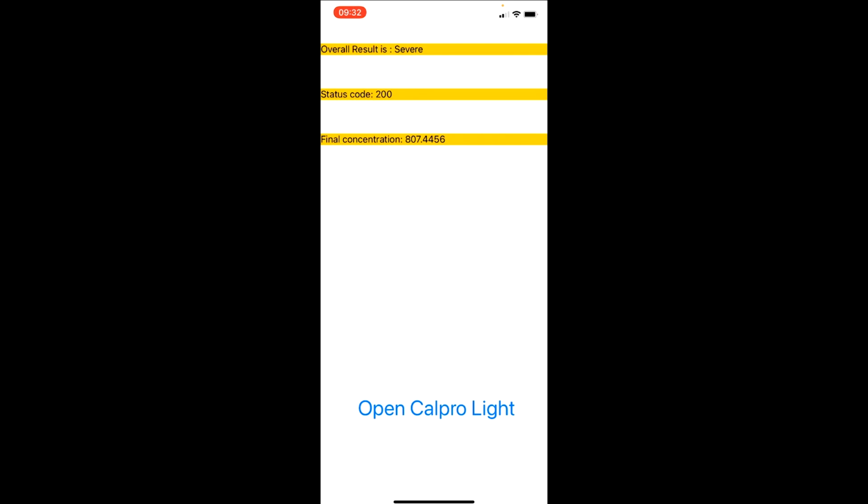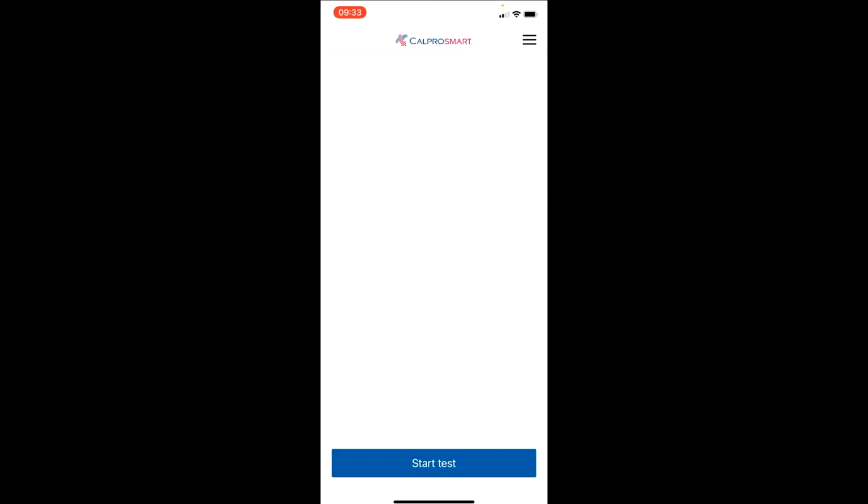As I mentioned, this is the test application. It will look much different in your apps. At this time, just so you can see, we have the result here, and you can also move back to CalproSmart and take a new test if you want.